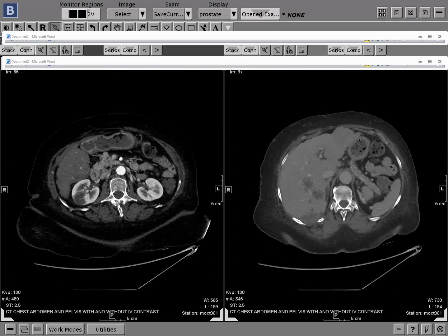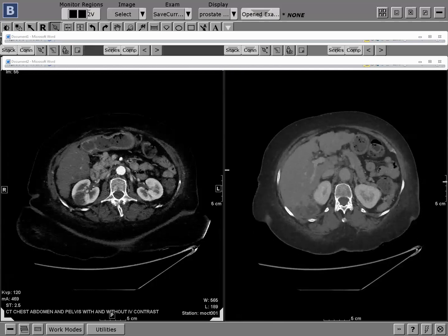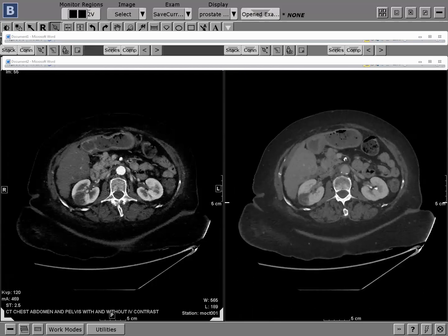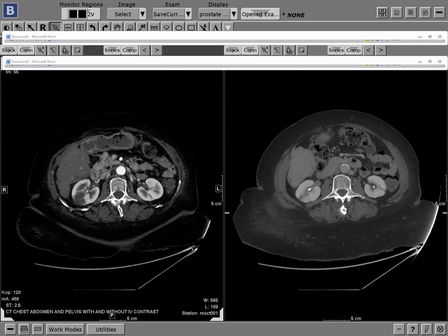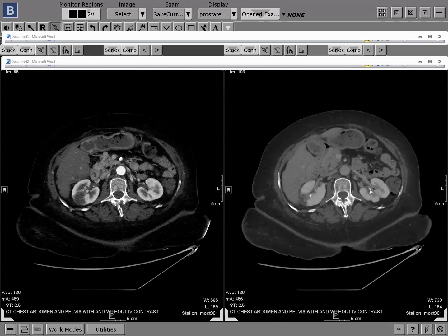I probably would have recommended biopsy had I not looked at that. I was very close to calling it infiltrative HCC, but then I thought, wait a second, this looks really, really similar to what we see in the liver. I think that kind of kicked my brain in the right direction.